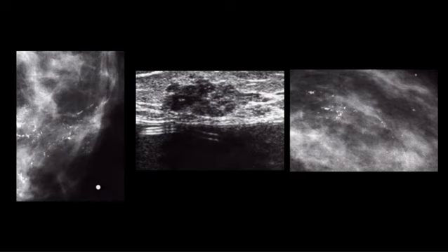For example, you can see here this is a metallic BB. We said it is something metal put over the suspicious area to localize it better. This is placed on the palpable area. There will be pleomorphic calcification demonstrating irregular, linear, round, and punctate forms.